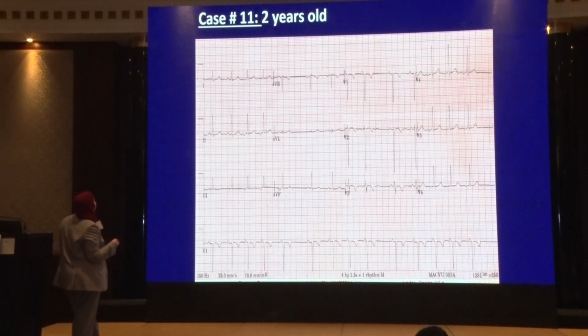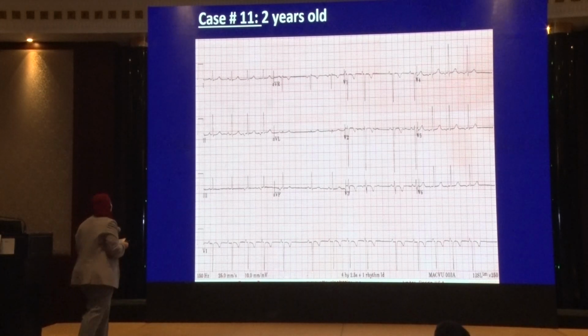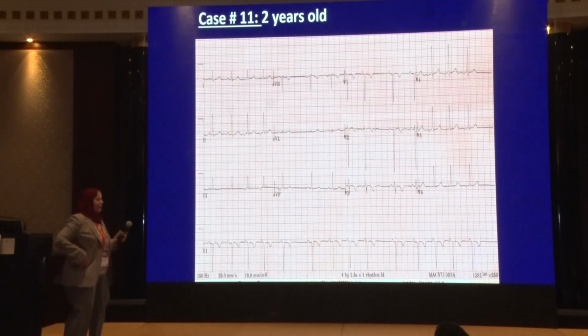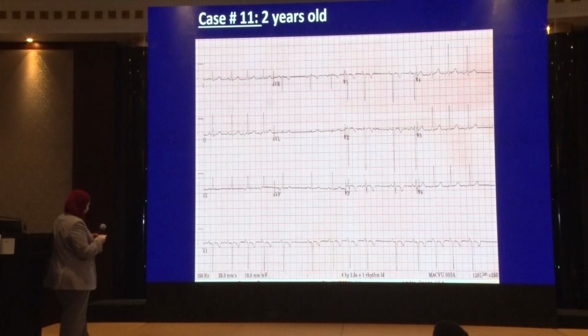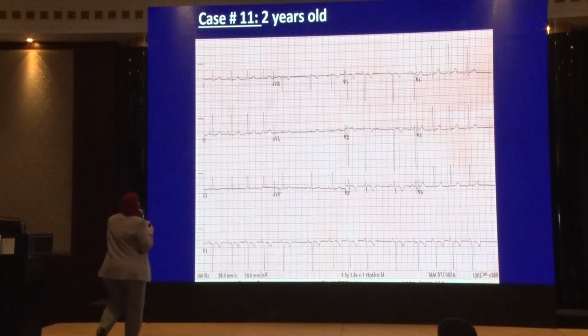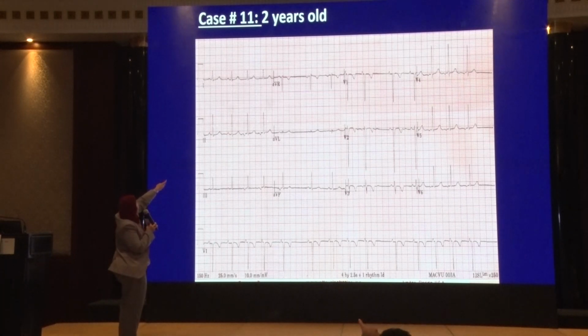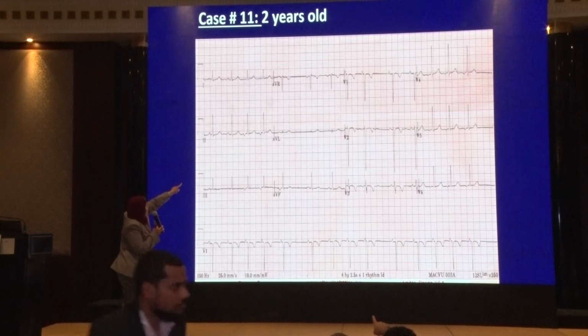Okay. Who wants to help? Normal calibration. Normal rate. Normal axis. Normal sinus rhythm. Does this patient have normal sinus rhythm? Look with me at lead 2. He has positive, then positive, then negative, then negative.